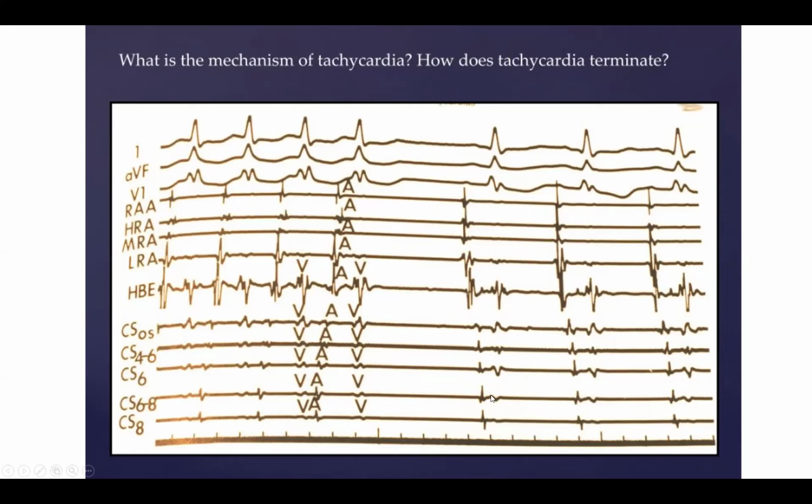eccentric atrioventricular conduction. Normally, the HIS V, corresponding to the QRS, would be the earliest V, and every V in the CS would be later and later and later because we would be depolarizing the left side passively, and it would take longer to get out to the CS. But because we have an accessory pathway, we actually can pre-excite the ventricle on the left-hand side earlier than usual, and so the AV interval is shorter.